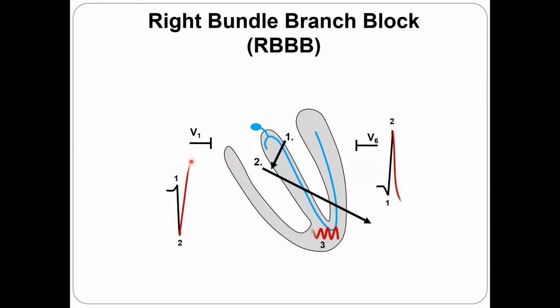It means that we do have a wide R wave in V1 and a deep S wave on the left side. So this is why the pattern is an RSR pattern, but sometimes it's not an RSR pattern, only a notched R. But as you see here, the ventricle activation time, or the ID time, is elongated on the right side and not influenced on the left side.